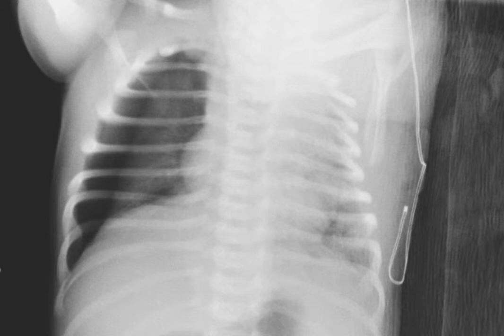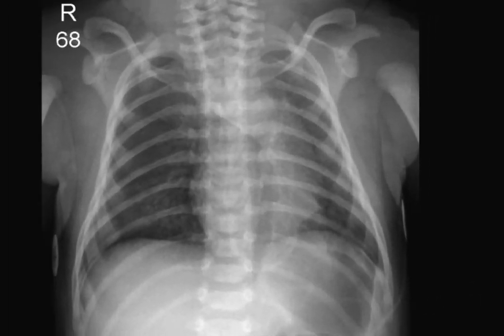You can see it's a little bit more than a 3% pneumothorax. It's fairly large. As I said, most neonatologists are perfectly aware that you really can't quantify a pneumothorax without getting a decubitus view, because you'll be fooled more often than not. This is the last example of pneumothorax I'm going to show you.